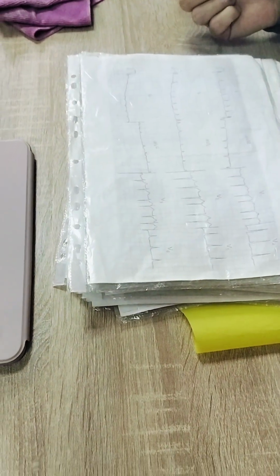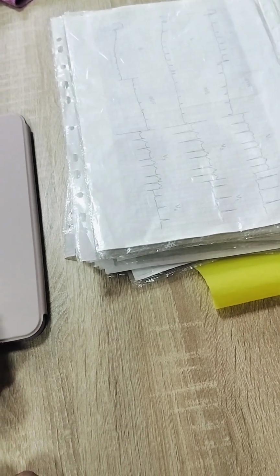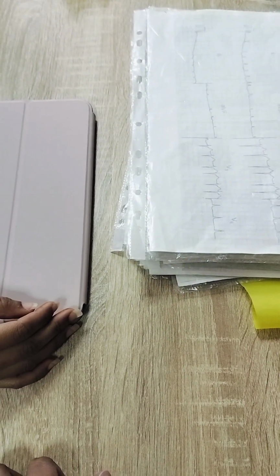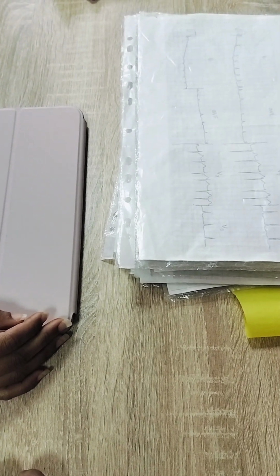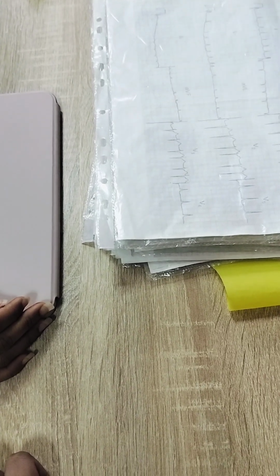Arrhythmia, yeah, it is atrial fibrillation, tachy type. Non-sinus tachyarrhythmia. But the final conclusion is tachy form of atrial fibrillation. It is the final conclusion. But step by step we find tachycardia, arrhythmia, and arrhythmia is non-sinus. Next one, electric axis of the heart.